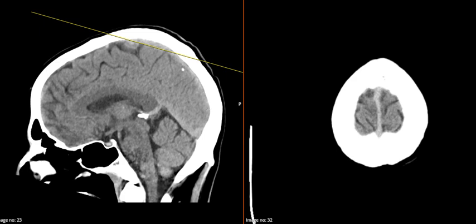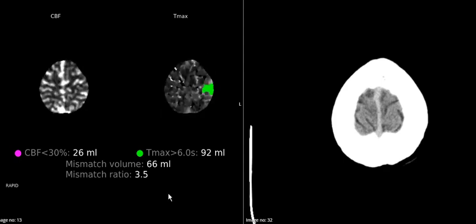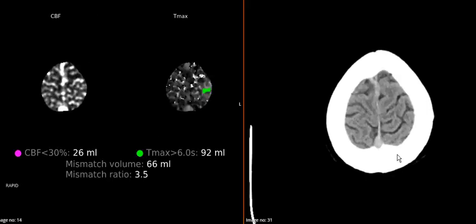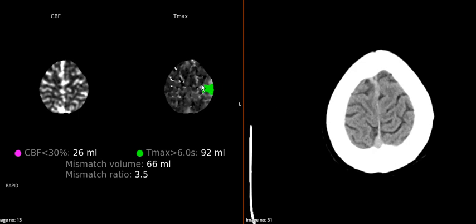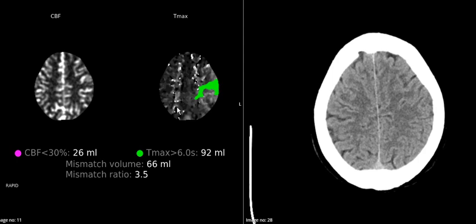So no obvious bleeding. But if we look at the perfusion weighted scans, which I'll bring in here, and we'll go to the top, and then link them so we should stay pretty much the same level. As we roll through, you'll see that there's some signal change here, time max. So the longer it takes to hit peak oxygen, the less oxygen you're delivering, and that is perfusion.